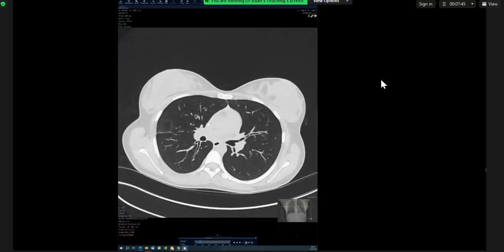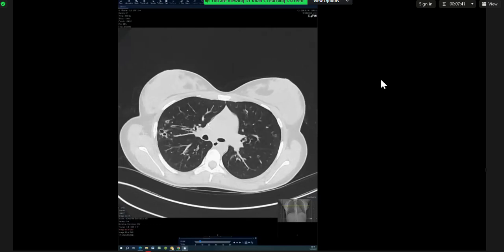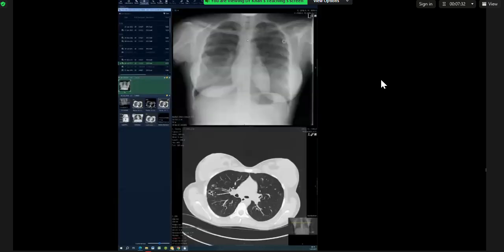I think you picked this tiny lesion as well on the radiograph, which was good. Yeah, bang on. The portacath is a hint, but you can't say you got the case because there's a portacath. It's a subtle hint. You can't bank the diagnosis on the fact the patient has a portacath. You can say it later on, but don't let it be the reason you say cystic fibrosis. Although that's why we all do it, let's make it not that obvious.